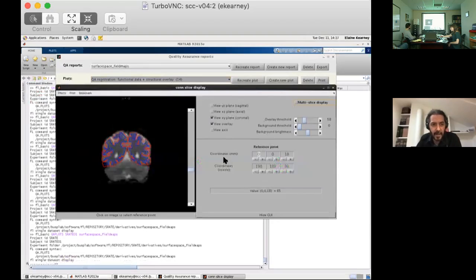So that might have created a new QA report. I probably should delete that, or I should have done it in a different directory. It's probably that we are actually looking at a new set of plots that were generated yesterday when I was fixing these violin plots, rather than the ones that you were working on before. I think it's not a big deal. I'll see if I can copy it, or make sure that when we generate a new report, the comments survive. I'll take a look at that.